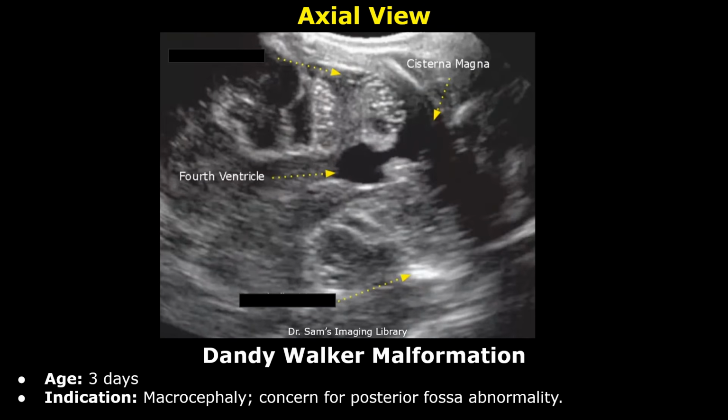This is a report example of Dandy-Walker malformation. Patient age is 3 days. Indication: macrocephaly, concern for posterior fossa abnormality.